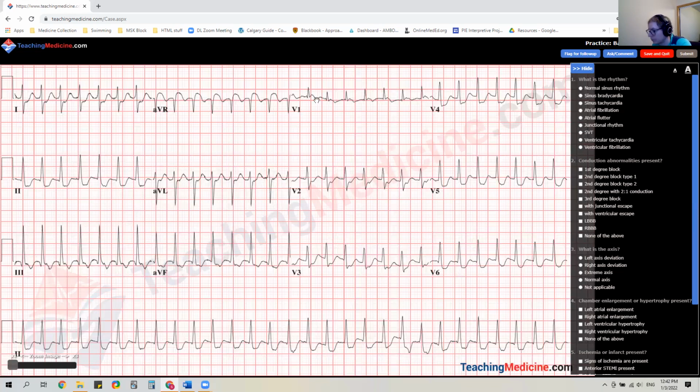Anterior leads. So it's about even. There's no Q, no Q, no Q, no Qs. ST segment. It's about level. Depressed, depressed, depressed.